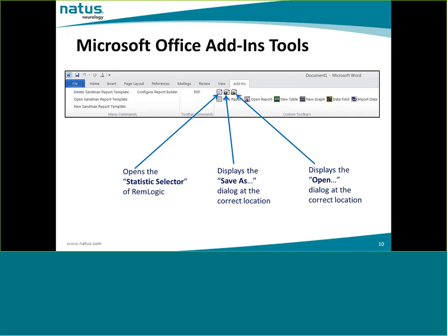The last one and the most important one will be the Statistics Selector. This is the one that contains all the elements that you need to insert for your reports.